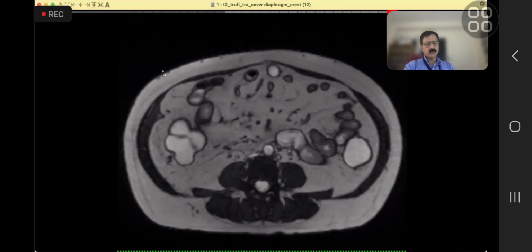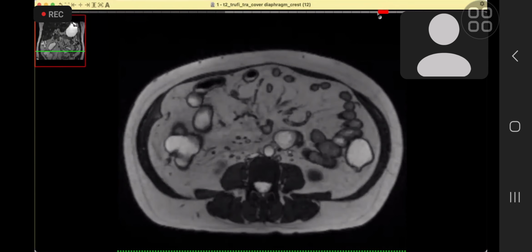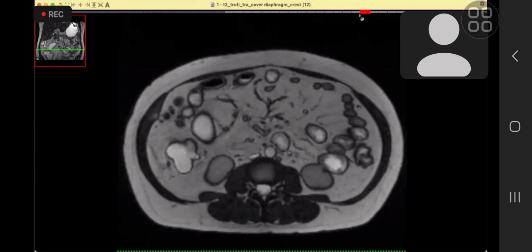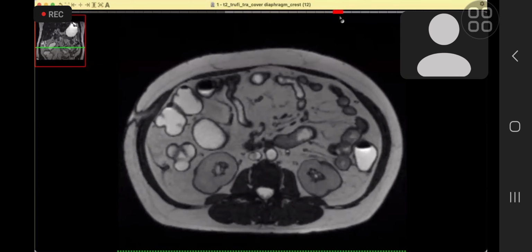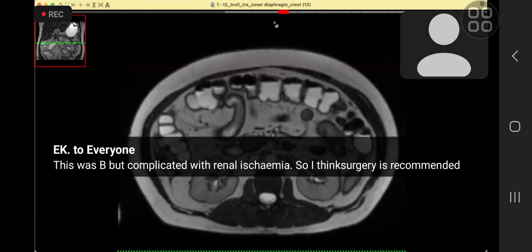Over to you. On the upper abdomen, there is quite normal distension of the small bowel loops. I can see only a few small lymph nodes in the mesentery. There is abnormal mural thickening involving the jejunal bowel loop, displaying iso-intense signal intensity in this T2 sequence. This could represent an inflammatory process.